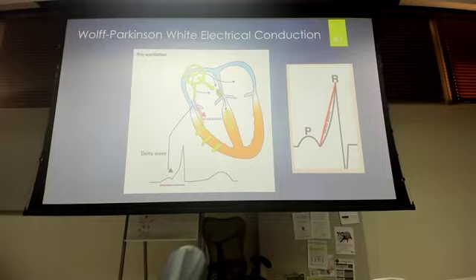And because they're depolarizing at slightly different rates, instead of going straight up and straight down, we've got either a convex or a concave area. It can be convex, but more often concave, of our R wave. Or it can even look a little squiggly as those depolarizations are occurring. What we don't see is that straight up and straight down. This concavity, or this kind of squiggly, is called our delta wave. And the delta wave is specifically associated with WPW.